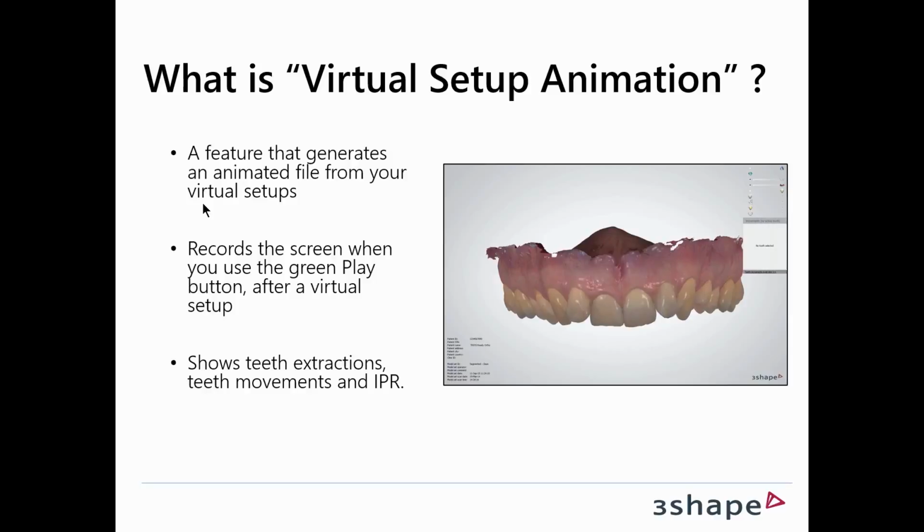Well, it's a feature that generates an animated file from your virtual setups, as you can see here on the right side of my screen. It records the screen when you use the green play button in the virtual setup, and it shows teeth extractions, teeth movements, and IPR slicing.